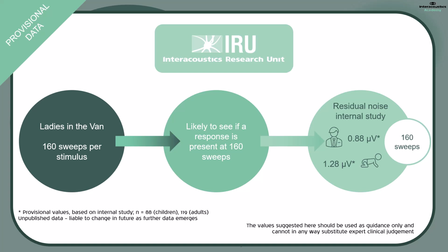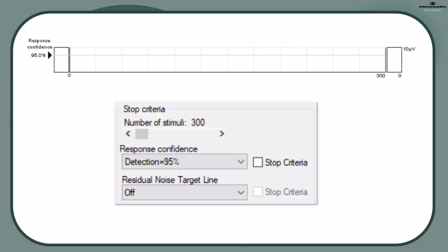These values could be used as stopping criteria to help determine when there is no recordable response present in the waveform. It is very important to highlight that these are provisional values based on internal unpublished data, and these values may change in the future as further data emerges. These provisional values have not been implemented into the default protocols as stopping criteria until there is more published data available. For now, these are suggested values, and individual end users can set this up within their protocols themselves if they wish to use these values.